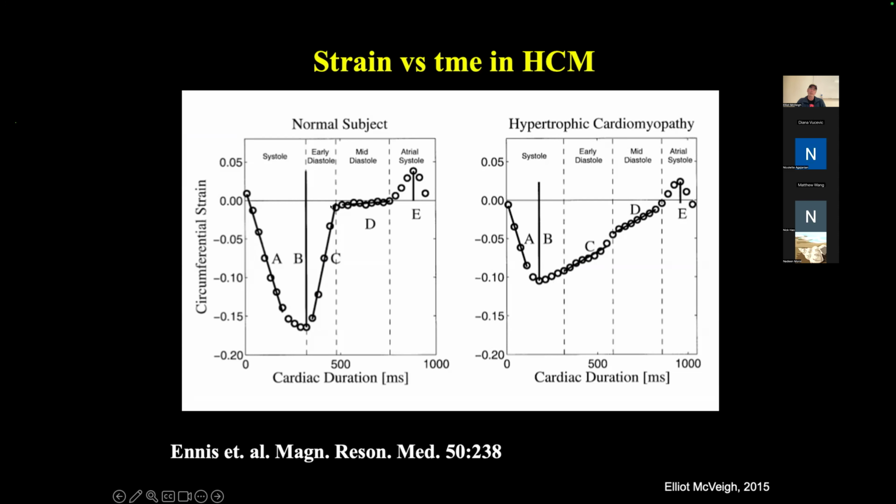And then boom, it pops open. And it pops open faster. The strain rate here is faster than it was on the contraction side. Okay, so the muscle relaxes, and it basically sucks blood in through the mitral valve. And then it sits in this condition for some time. This is diastasis. So your heart's just filled with blood, and now it's just resting there, right?